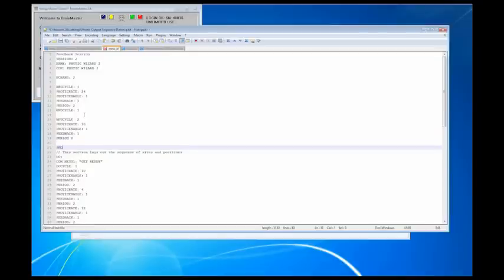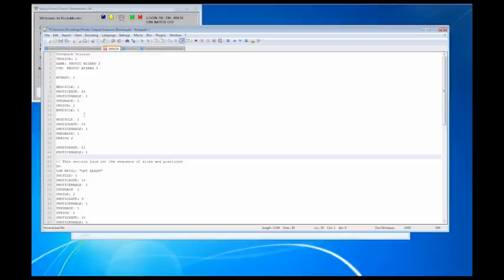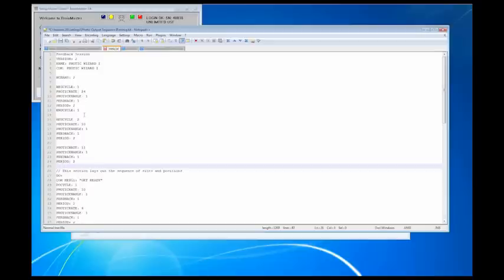Then I'm going to go photic rate 11, photic enable 1, feedback 1, period, and see, look at that, you always got to make sure you got the right context there. Period 2 and end cycle 2.